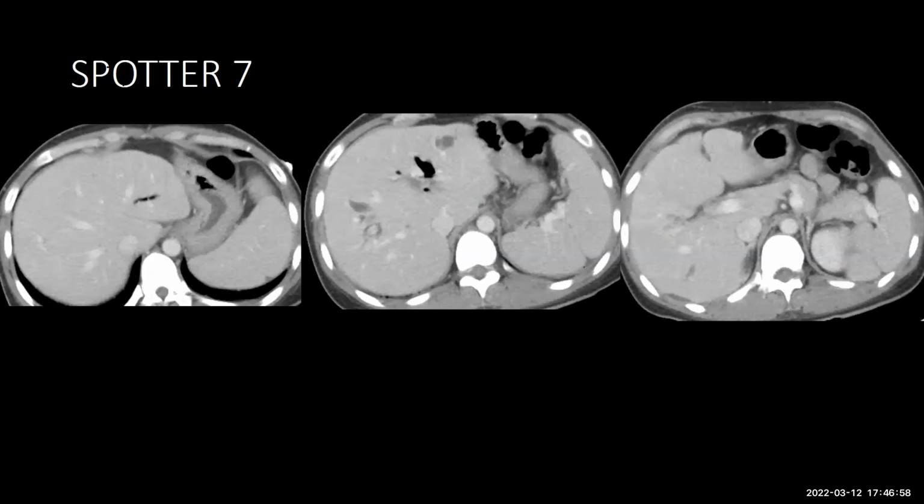So now this one is a little difficult one. Let's see. There is air within, yes, very good. So that's post procedural. They have done some procedure. Okay, then what else is there? Anything else you can find? There is intrahepatic biliary radical dilatation on the right side, and on the left side also you can see. Correct, isn't it? This is the left side dilatation. So what do you think it is? Any clue in this image? Just say what is the diagnosis.